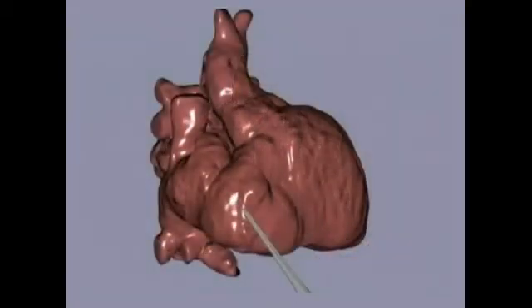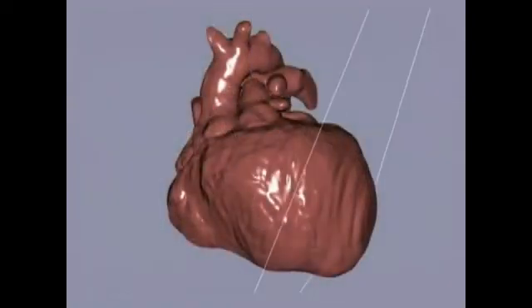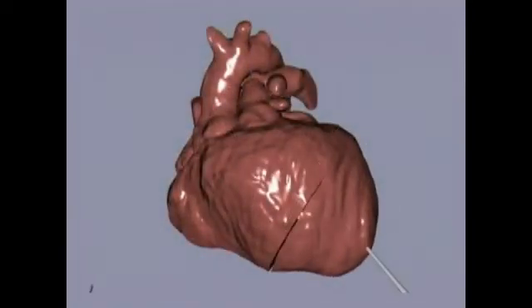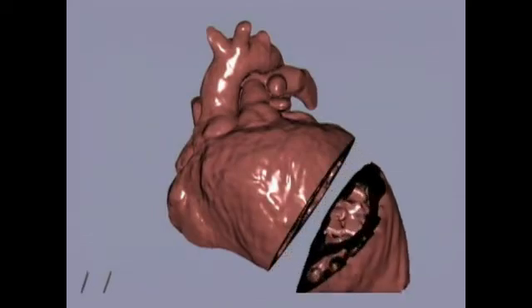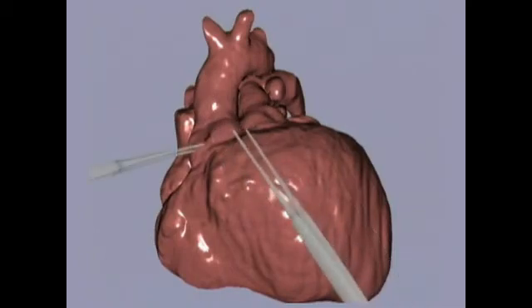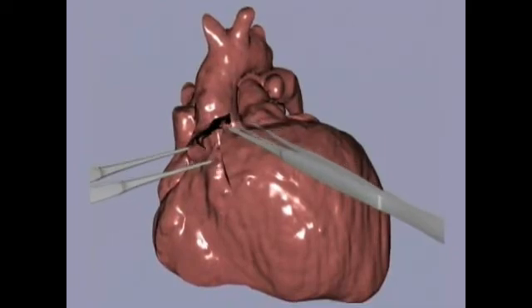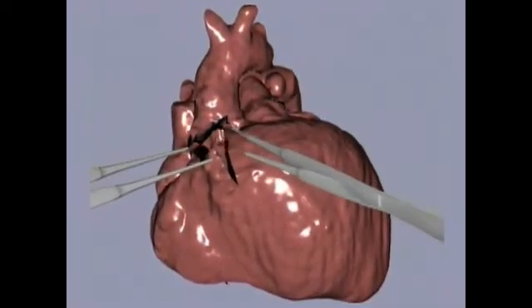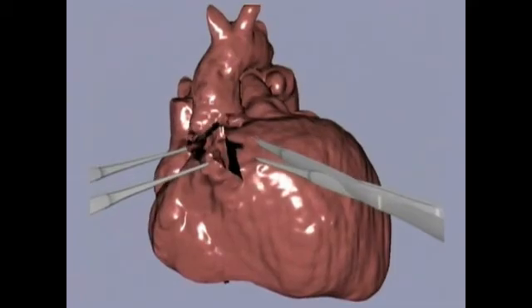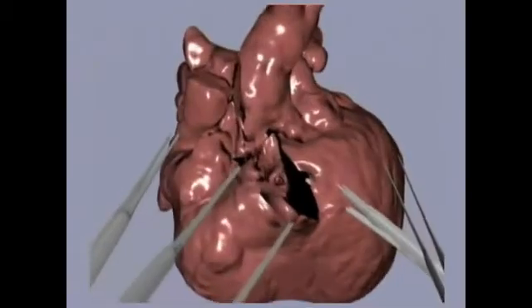In the remainder of this movie, we will be watching annotated simulations of several surgical strategies and explorations. The goal is to determine the optimal incision points to allow the surgeon to reach in and close the two septal defects. An incision is made at the aortic root. When the tissue is pulled aside and fixed using the available instruments, a view of the interior tunnel is revealed.